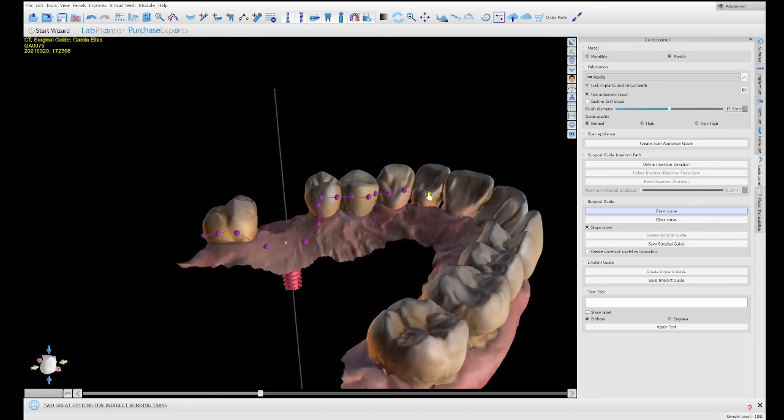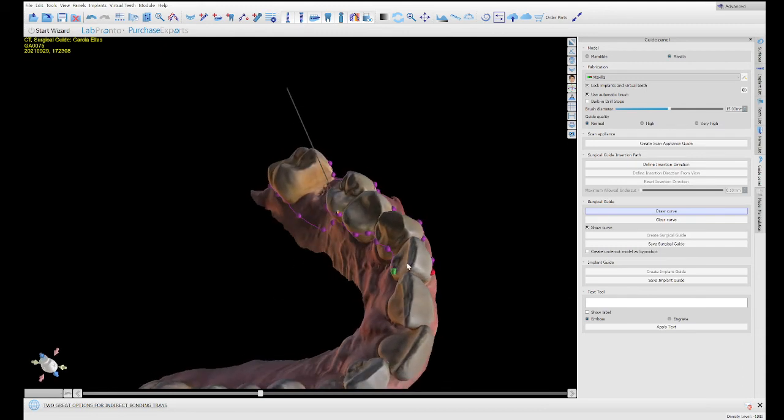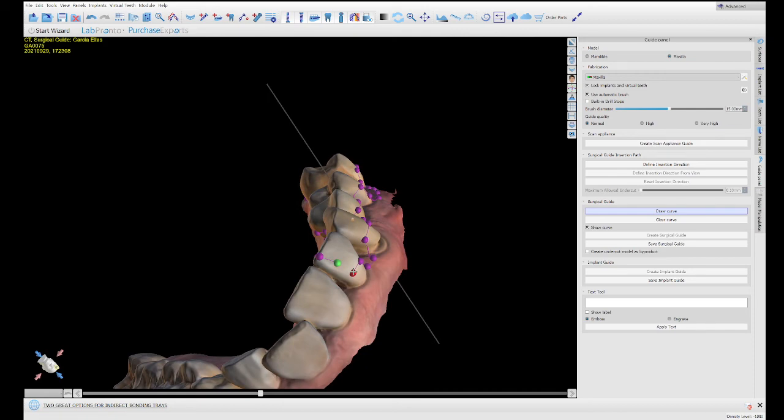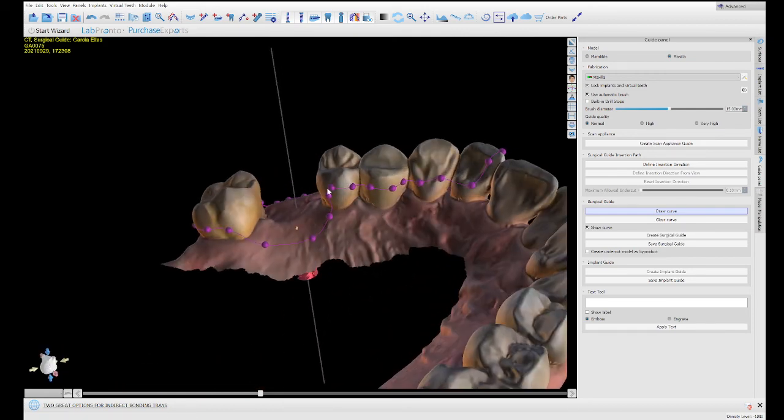Oops. So you can move this around. And after you close that, you can now also move things around if you want more soft tissue support. In this case, you don't need it because it's too supported. This is more than enough. So you create some support over here. If you want to make it thicker so it doesn't break, that's fine with me.